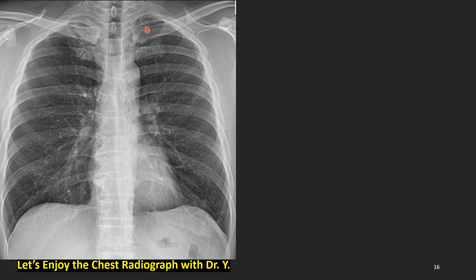We will enjoy the missed lung cancer areas from the top going down to the bottom this way. How about this film? What do we see? We have seen this film before. Let's look at the first rib. I called it owl's eyes. Yes, the right side owl's eyes are not clear, something like a cataract. The left side is okay. Yes, that's correct. This is a superior sulcus tumor.